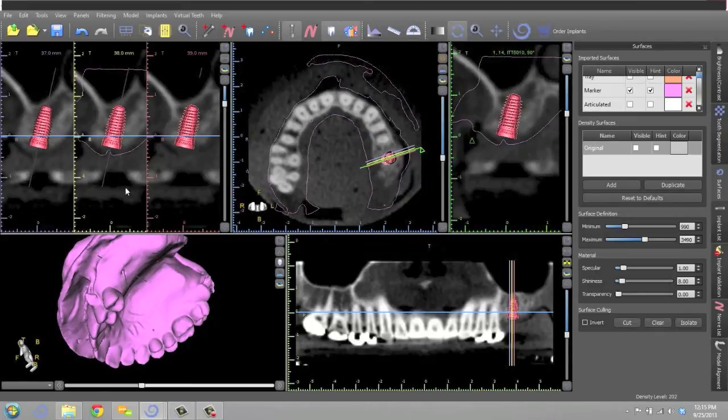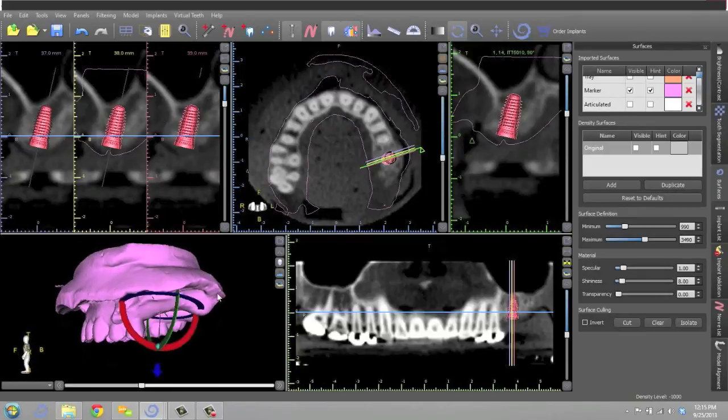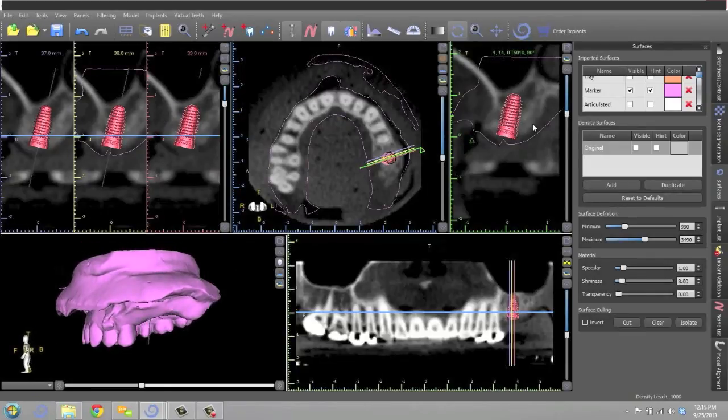So this is really helpful in telling you that this particular alignment should be a home run, because you know it's in the apex of the soft tissue ridge because it's in the divot. So that's how you can learn about your soft tissue depth.